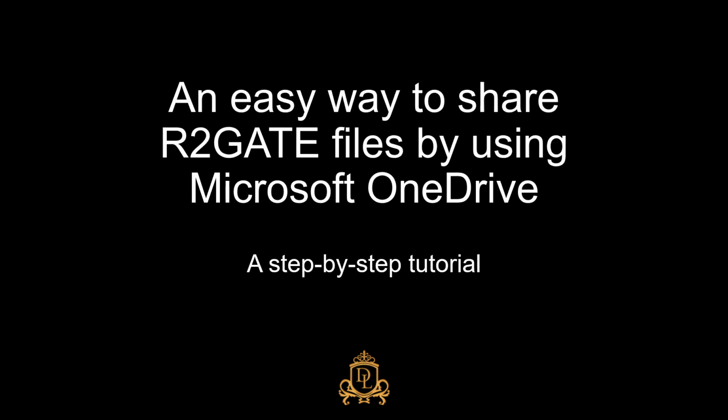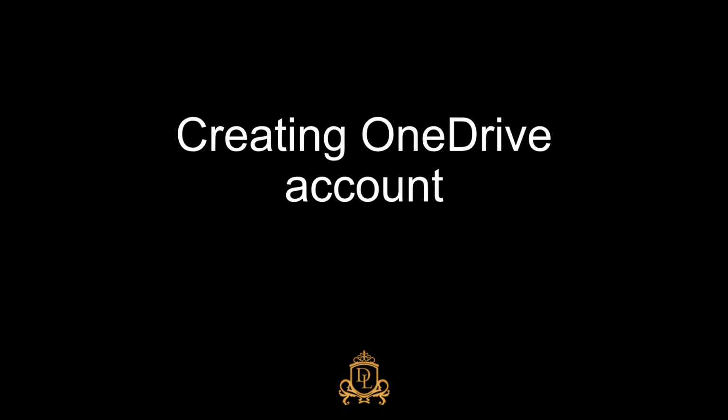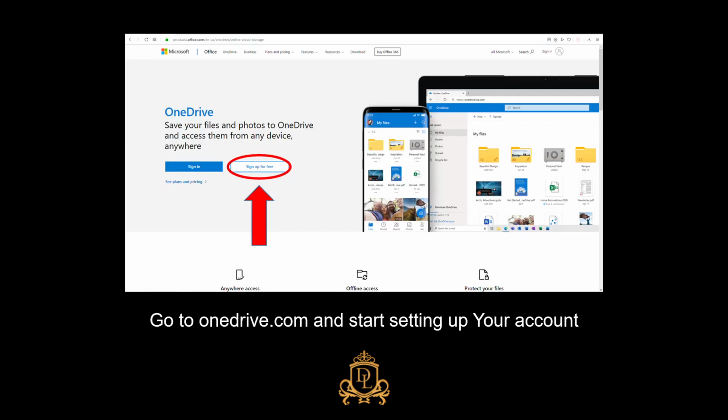www.dentalab.ee. The cooperation between doctors and R2GATE Center can be very stressful due to difficult file sharing regarding different platforms. So I will guide you through a step-by-step tutorial on how to establish an easy yet trustworthy connection. We will start off by creating a Microsoft OneDrive account.